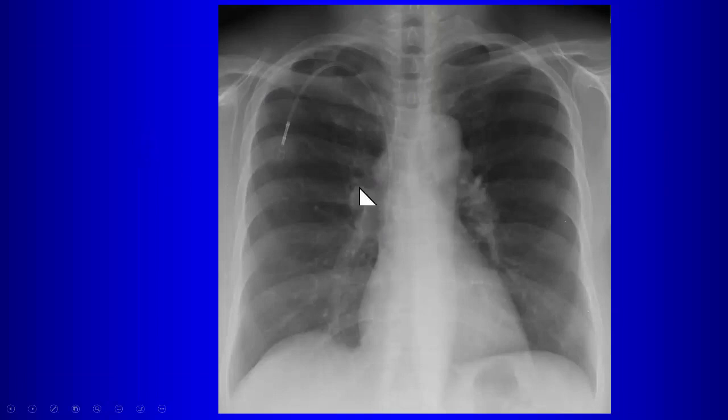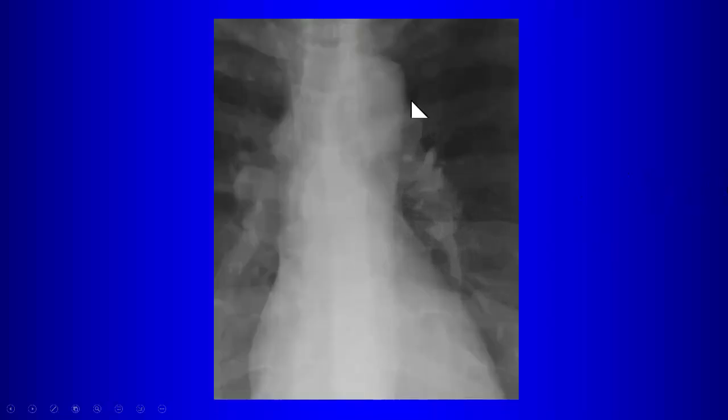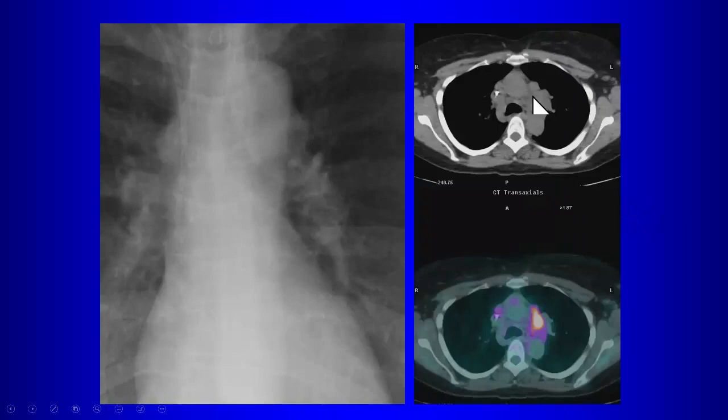This one? So you're worried about this? Anything else you're worried about? AP window, look at that, right? You don't want to miss that, right? So if you're wondering if this is real or if you should worry on this case, of course, it's a metaport, which kind of gives away the game, but AP window, there's bulging in the AP window, there's lymphadenopathy there. Okay, so it's AP window lymphadenopathy in this patient. Also, you see the PET scan there, okay?